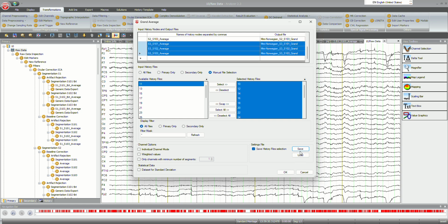This is useful because it can be reused afterwards, so you can come here to this area and load one of these, and this will fill in the information over here, which is pretty useful. So it'll save you a few minutes.